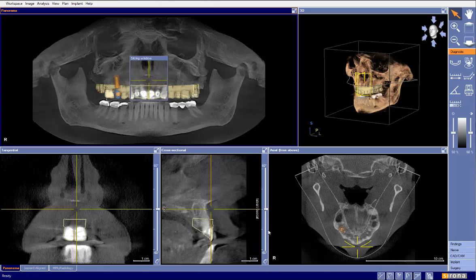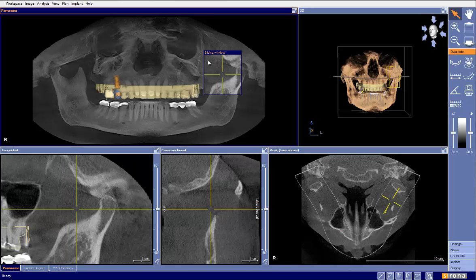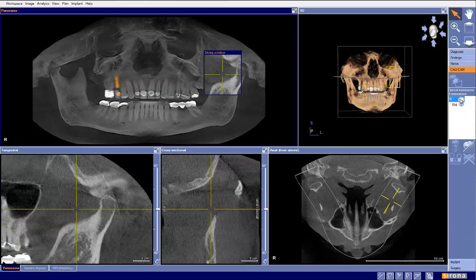Okay, let's take a look. We've been sent a case here for tooth number 4. In this particular case, we have CEREC data here. In looking at it, my first look is, is this a good CEREC OptiGuide case? And the answer is yes.